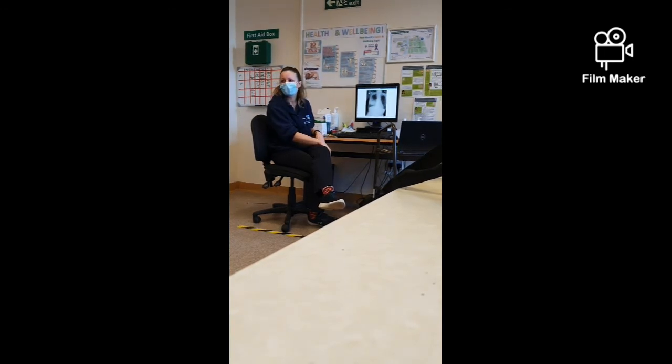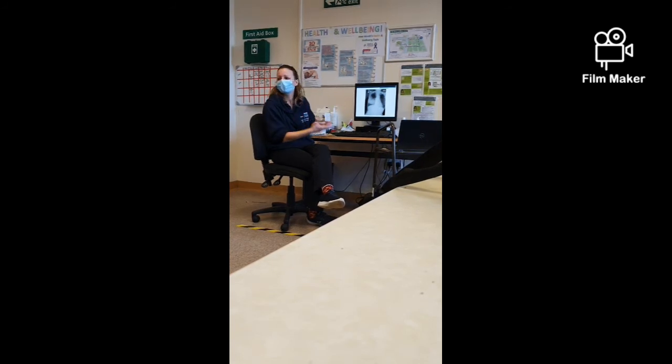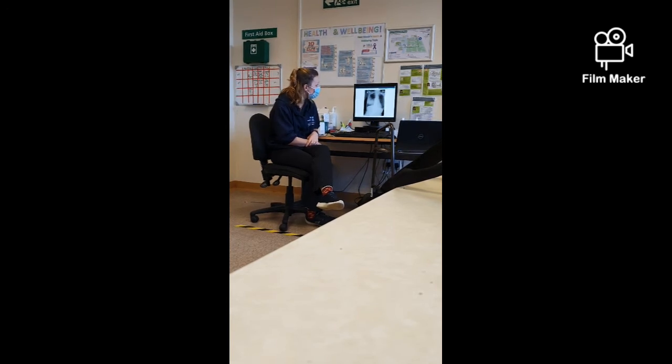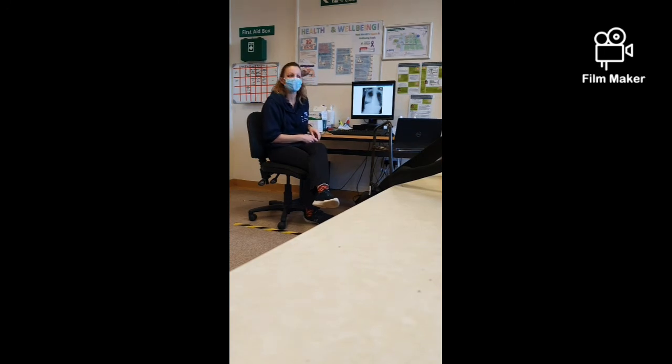We need to go through what? A to E. So someone wants to start off in the A part? Pretty central. Yeah, so it's pretty central, isn't it? So we're happy with the airway, so let's move on to B, the breathing.